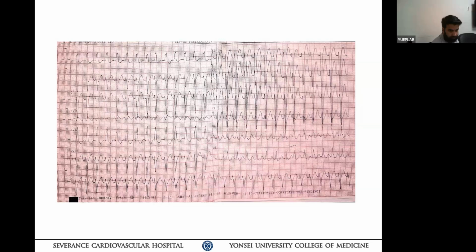in lead V1, it has an LBBB-like morphology, but I don't think it's a typical LBBB. Maybe a non-specific conduction abnormality. Intrinsic deflection time is also a bit sharp. It's not too broad.